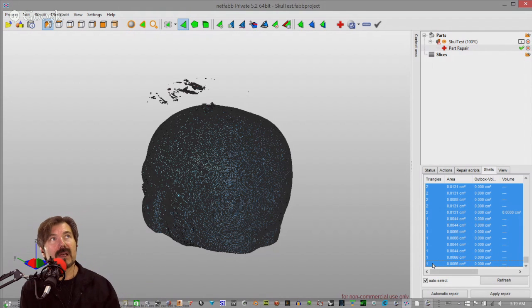Now, again, a lot of this, if we had taken more time, we could clean up like I was showing you within the application itself. But I use a combination of these two, one to make a solid model that I can print. So when we get done with this, I still don't think we'll be ready, but there are a couple of other tools that we'll be able to use to create a print-ready model. So I think it's kind of a 1-2.